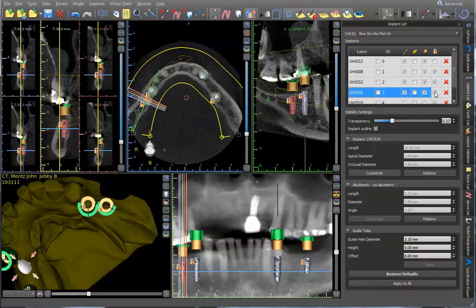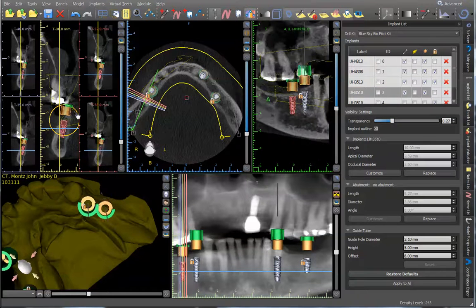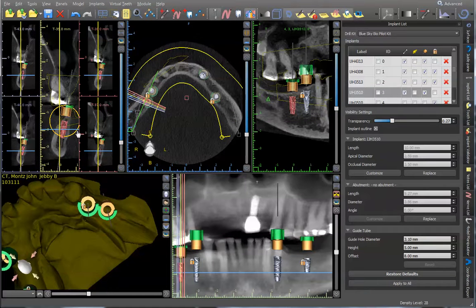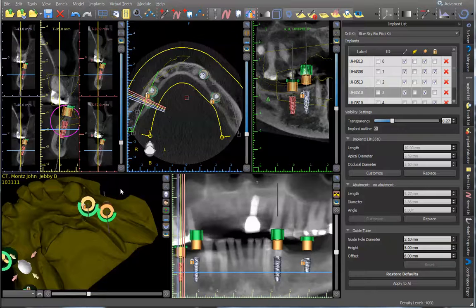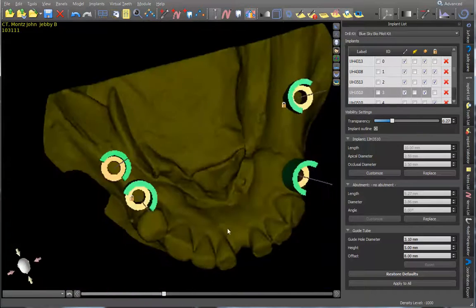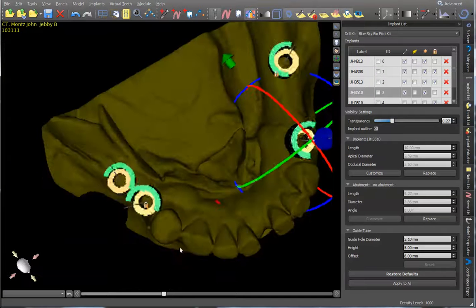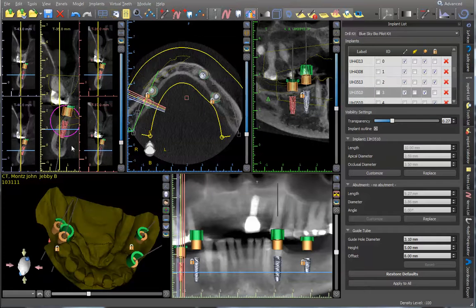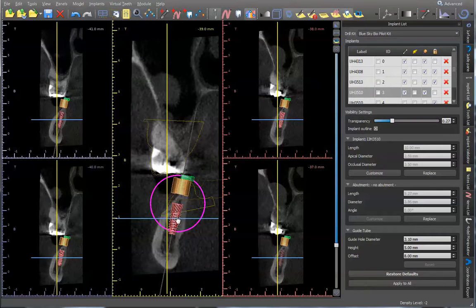Go back into implant, click off of that. I'm going to have to rotate this a little bit more. Restoratively, that's going to be a little bit better. And I'll scoot it back a little bit more. That looks good. Better, not great. I'm not happy with the bone volume in this area, so I'll probably add some PRF and some bone graft for sure on the buccal. But this looks a little bit better in the bony housing. I could even angle that a little bit more. It just seems really angled to me in this cross section, but it's looking better on the model.